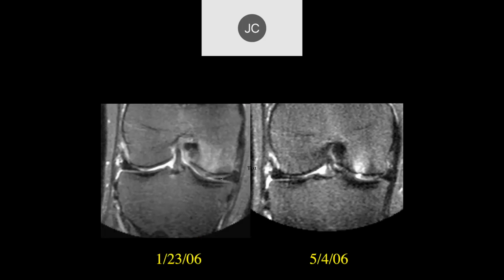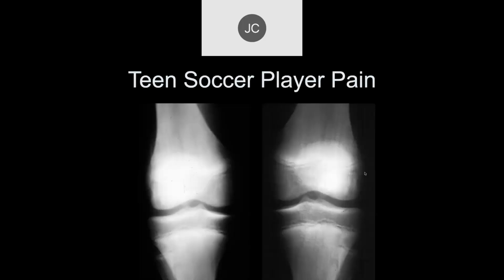And then here's just an injury to the bone. You can see the cartilage is abnormal signal, but it looks like it's grossly intact. The patient continued to weight bear, and we can see that the cartilage has a full thickness defect, and now we've got underlying marrow edema. So this is progressive degenerative disease in this particular patient.